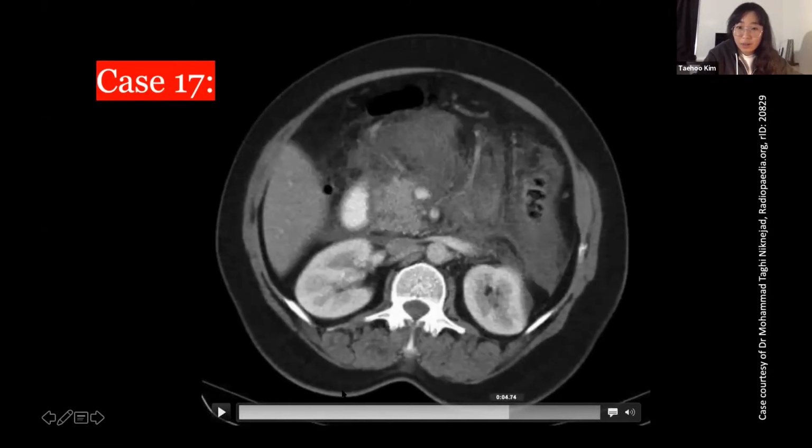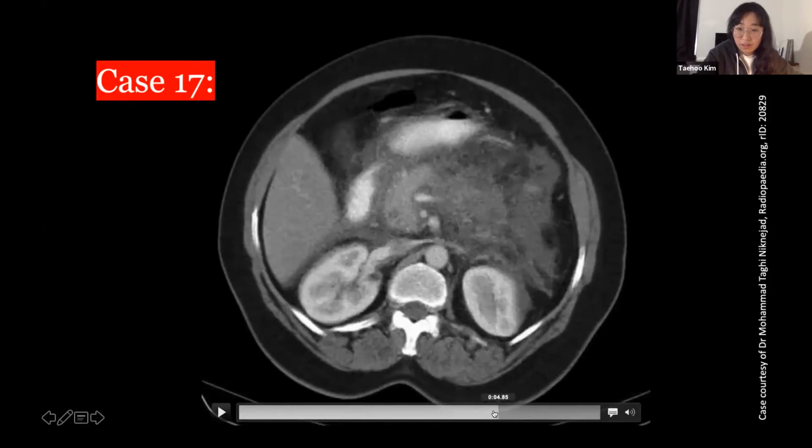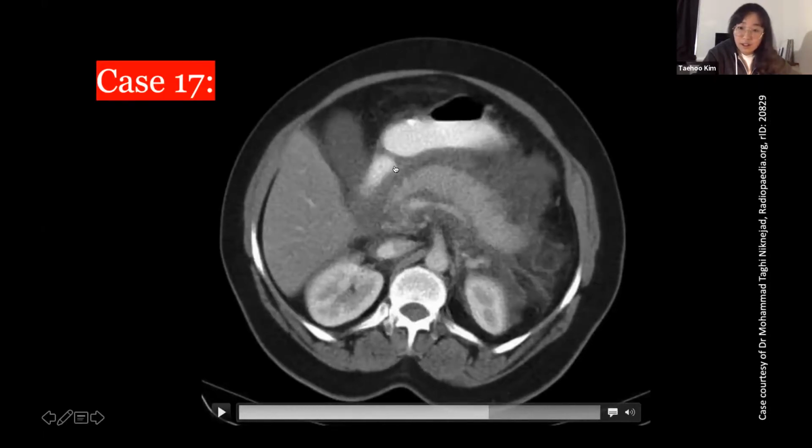Again, here what we'll be looking for is not only the inflamed pancreas, which you can appreciate better than the earlier case. There's a lot of stranding and free fluid, but you also have to look for abscesses. Abscesses look like a very well-defined collection with rim enhancement, enhancing like this kidney, but there's nothing around.